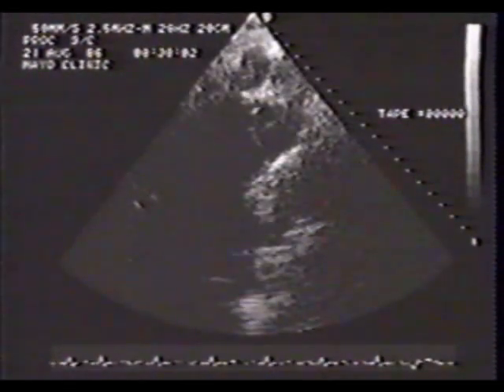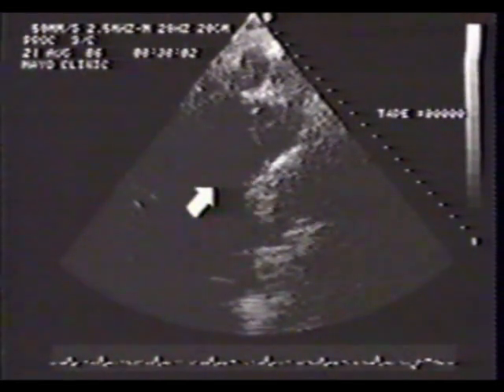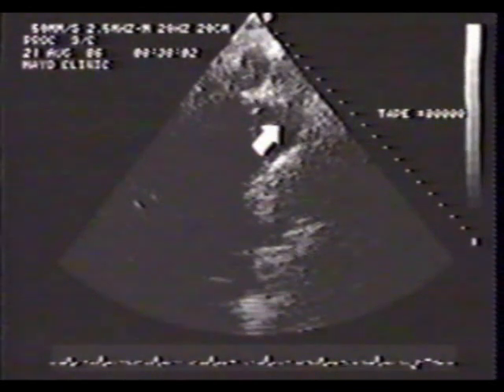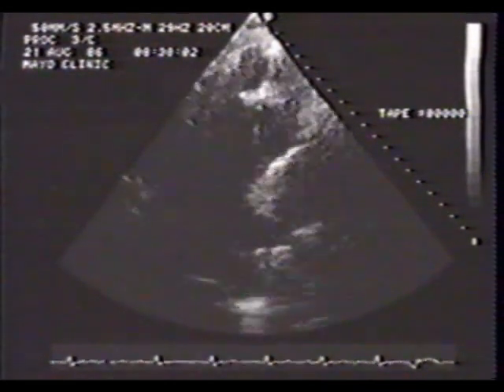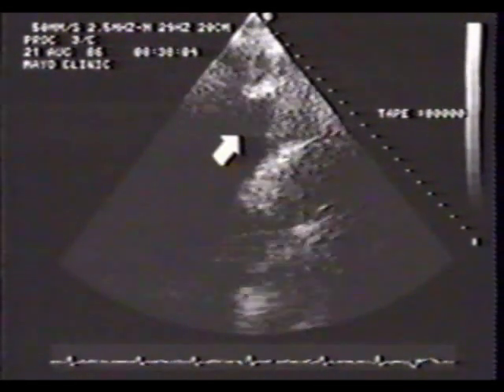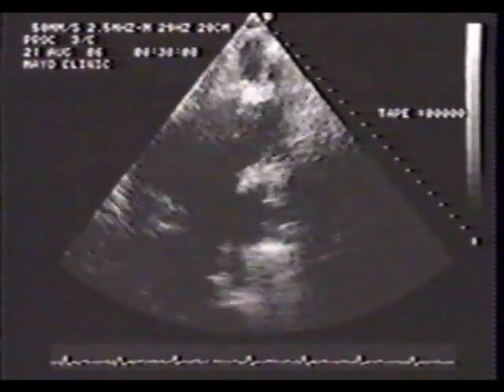The flap is also evident on this suprasternal notch view at the junction of the ascending aorta with the horizontal portion of the arch. Remember that dissection can not only cause severe chest pain, but can also cause myocardial infarction via coronary dissection. Excluding this etiology of infarction is critical, prior to administering acute thrombolytic therapy.